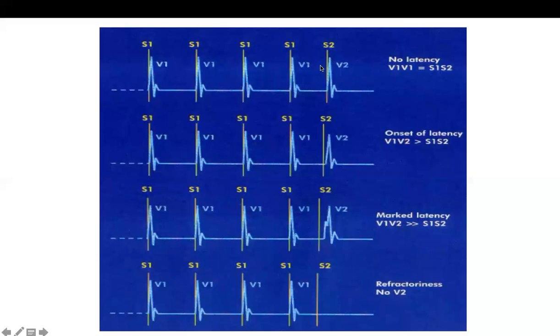Whenever you shorten that, you are going to stress the tissue itself of that structure. We are not examining the effect of this on the conduction beyond that tissue. We are testing the tissue property, of the ventricle or of the atrium.